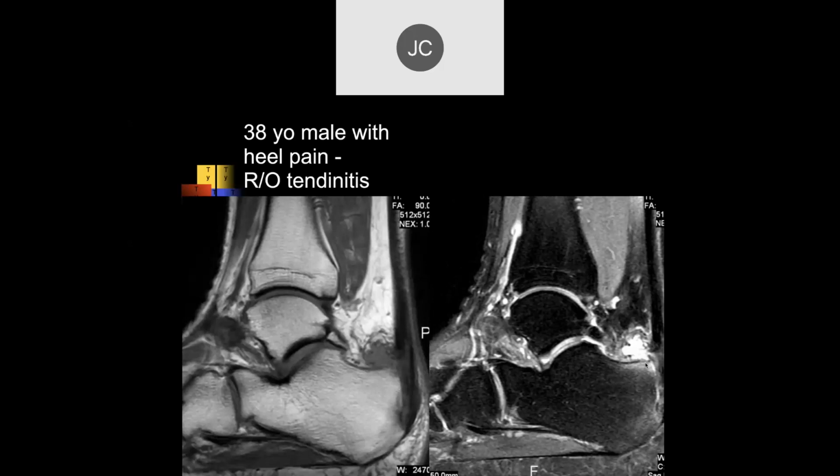And here, you can see the inflammatory process is already at work, I would think, right, John? Yeah, the healing process is already there. All you have to do is help it so that it doesn't put tension on it. Tension is the worst thing you can do on a tendon when it's lacerated.